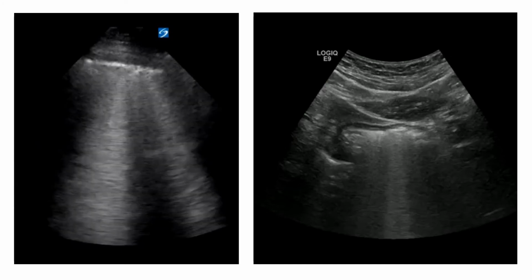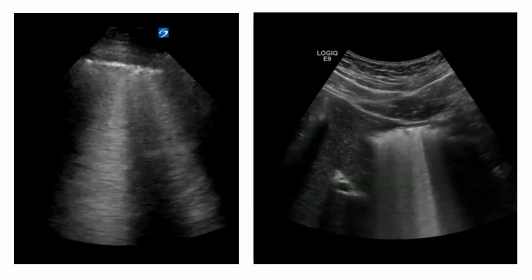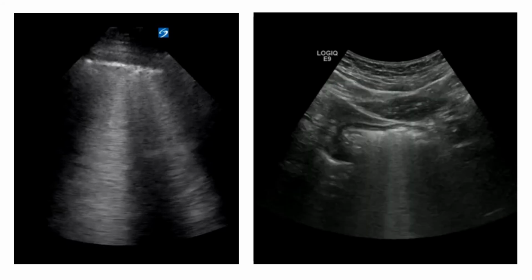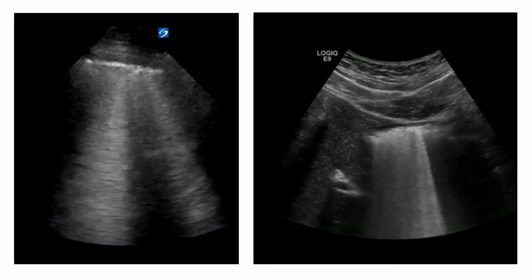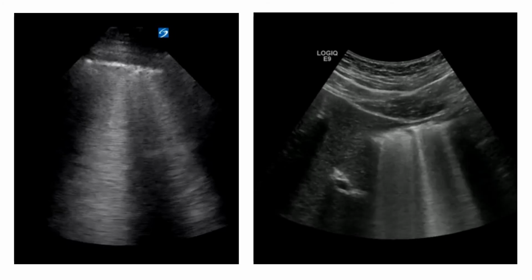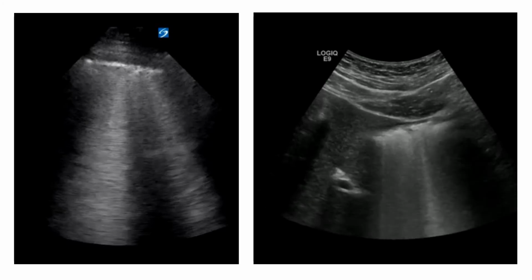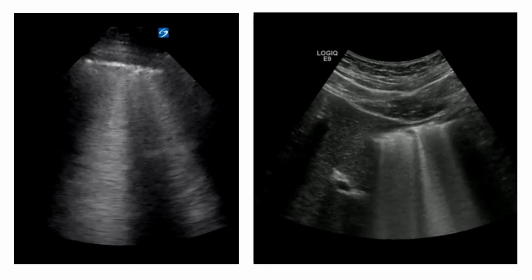It's just what we call them when we see it in the lung. Now, obviously this isn't the only place that you would see ring down artifact. You can sometimes see it in bowel. On this picture on the right, you can see a small section of small intestine with what looks like some B lines shooting through it. Except they're not called B lines here because they're not in the lung. We would just call this ring down artifact. And again, it's produced by the gas in the bowel mixing with the fluid in the bowel and creating a funky sound wave that gives you this picture.